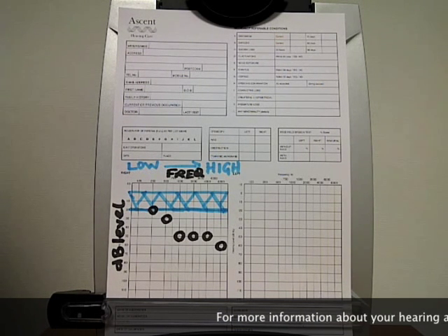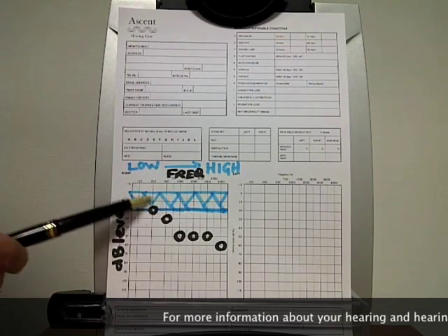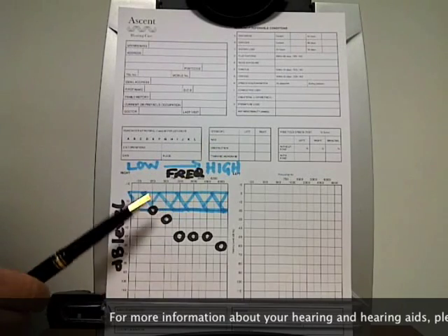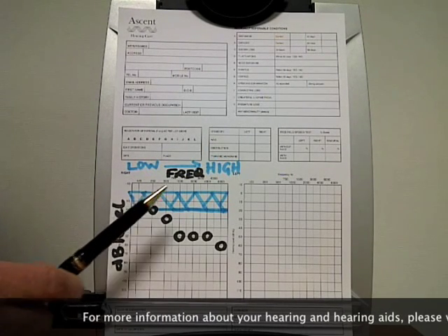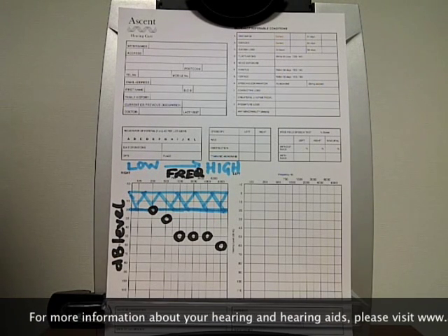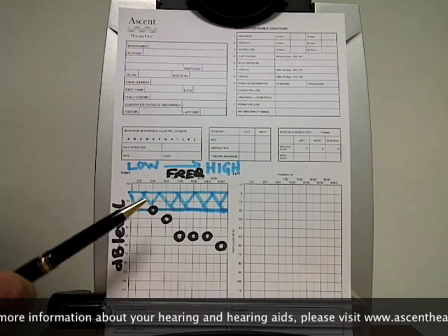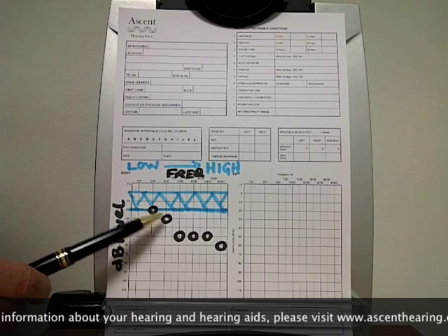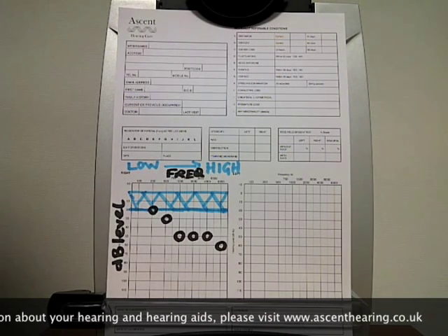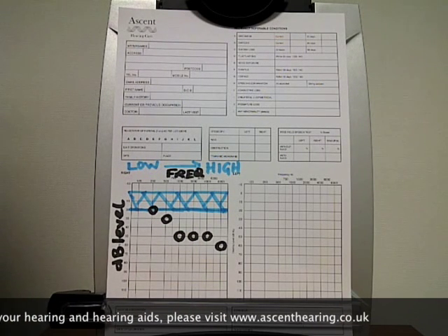of hearing. What I've now done is I've added on what we call the normal range for the normal population. So if you go in and have a hearing test, dead easy, as you know from the videos you've seen already, and your hearing levels fall within this shaded area here, the audiologist will conclude that your hearing is within normal limits. Basically, in this particular example, the air conduction thresholds beyond the very low frequency here at 250 Hz fall outside that range, and the conclusion is that there is a hearing loss.